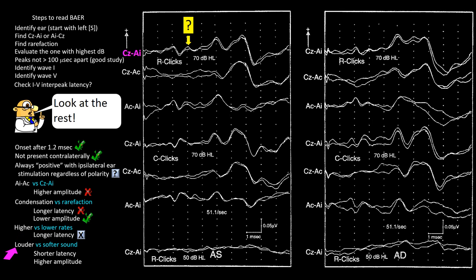Next, we see the difference between waves obtained during louder sounds from those obtained during softer sounds. Those with louder sounds should have a shorter latency.